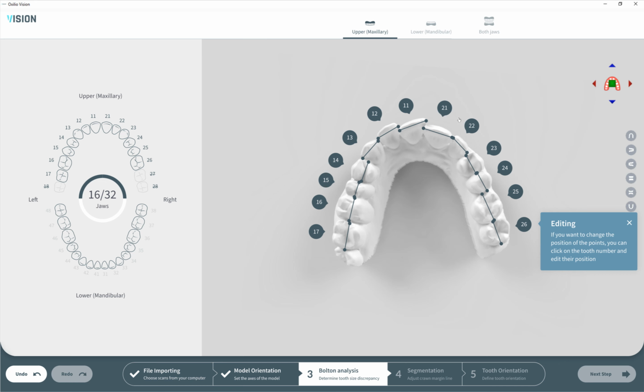And it will help us not to make a mistake by selecting shifted numbers of the teeth. And of course, we can select each of them and edit it from the inside. You cannot edit it while seeing all the lines around. That will help you not to make unnecessary moves or accidentally shift the points.